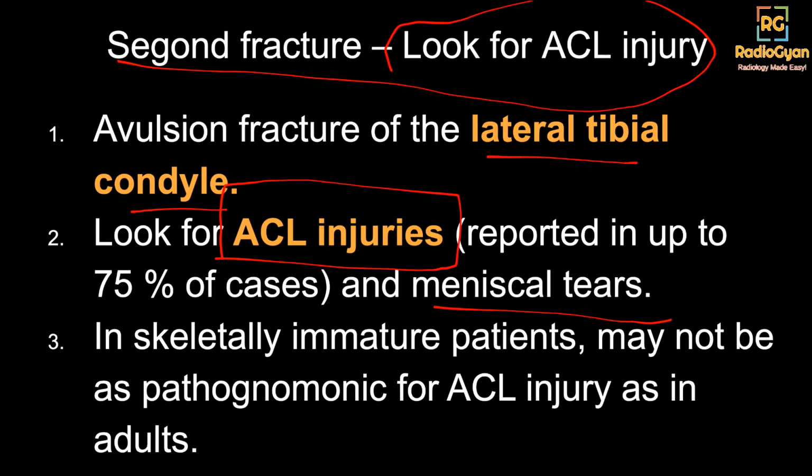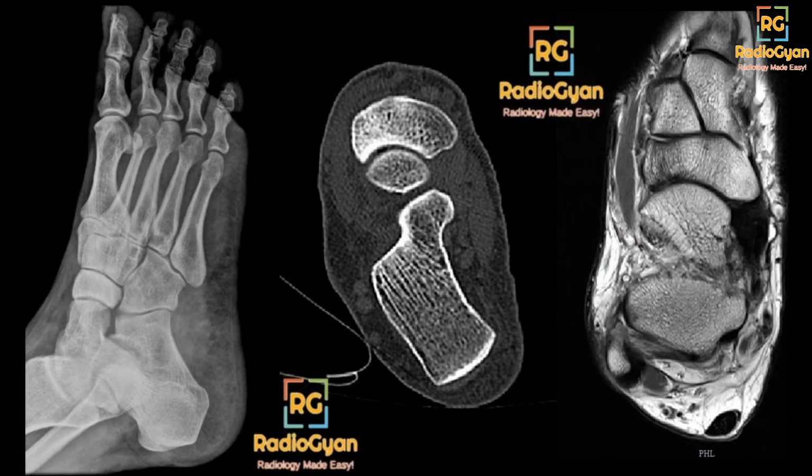Okay, moving on to this case. This is a tough case. Not a spotter. I don't expect a lot of you to get it right. If you get it, that's very good, but I just had an interesting case, so I thought I'll share. But even if you don't get this one, it's perfectly fine. Even I would not get it if I was attempting a spot set.